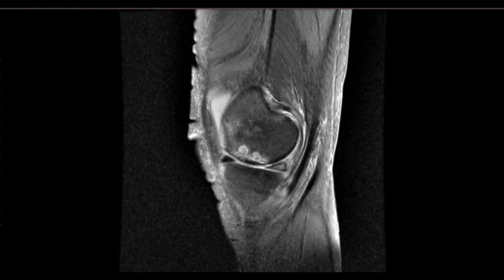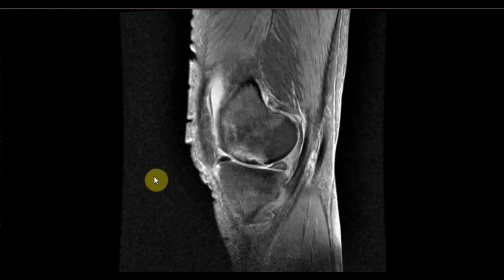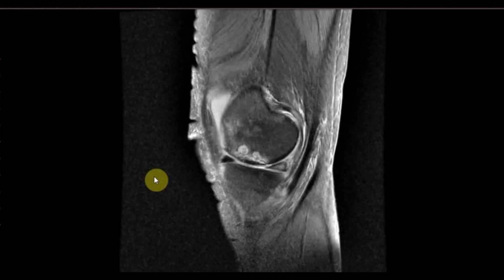Now coming to this area, as this is the MRI of a 55-year-old female who is osteoporotic, this is an area of osteochondral defect, and the overlying bone is osteonecrotic. It is hypointense on the sequence, and there are multiple areas of cystic changes in the underlying bone. So this is a subchondral insufficiency fracture with formation of osteochondral defect with involvement of the overlying cartilage, and this fragment is unstable as it is outlined by the areas of hyperintensity and cystic degeneration.